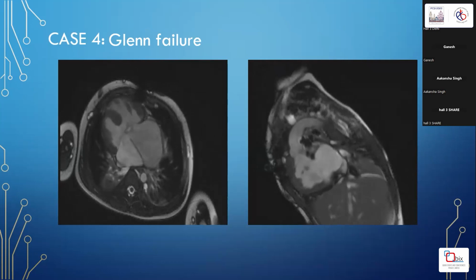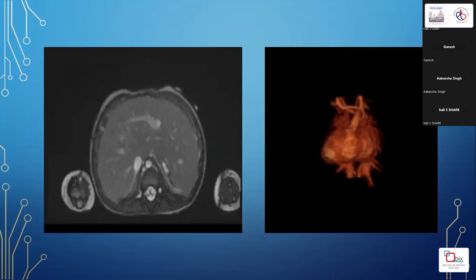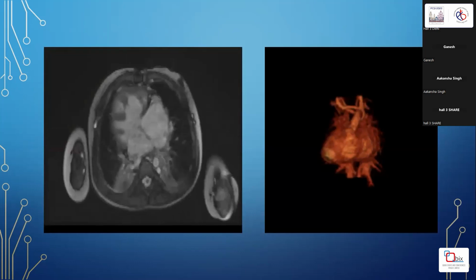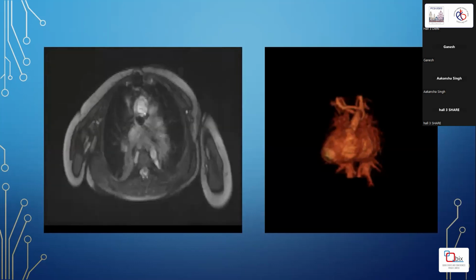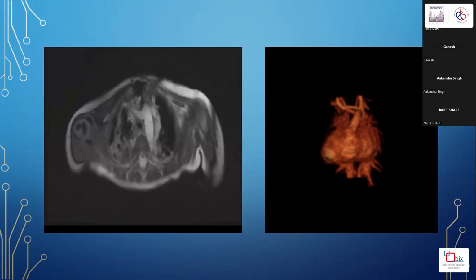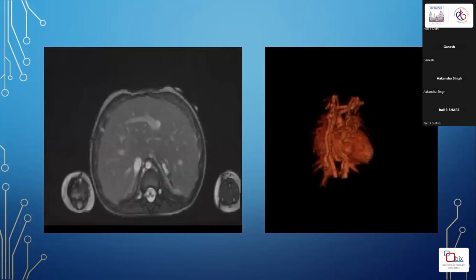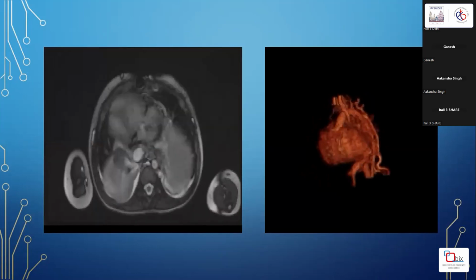Aorta was from RV. There was essentially no antegrade flow across the pulmonary artery. There was no discrete stenosis in the Glenn that had been done as an initial palliation. Ipsilateral hepatic venous drainage, left pulmonary vein obstruction, and the 3D reconstruction showed us that there were obviously multiple collaterals. So something was wrong in this initial Glenn palliation.